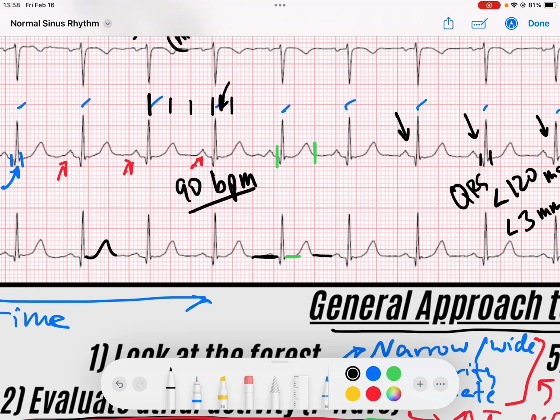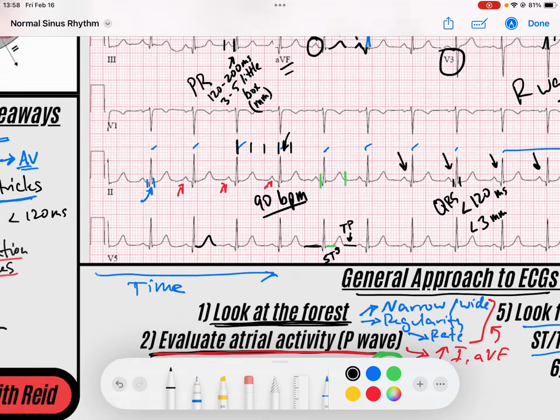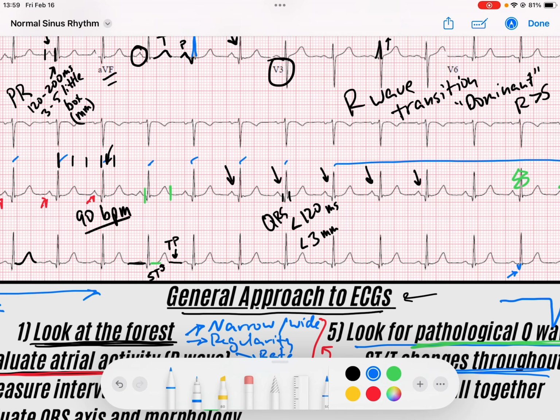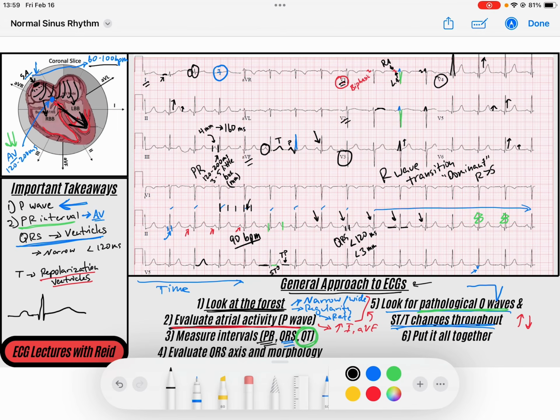the P. So it's kind of like my TP, and this is my ST, right? And so ST segment changes essentially are telling me that there are repolarization abnormalities that are associated with ischemia. And so we should see a flat baseline throughout all the leads. And you want to use the leads anatomically.